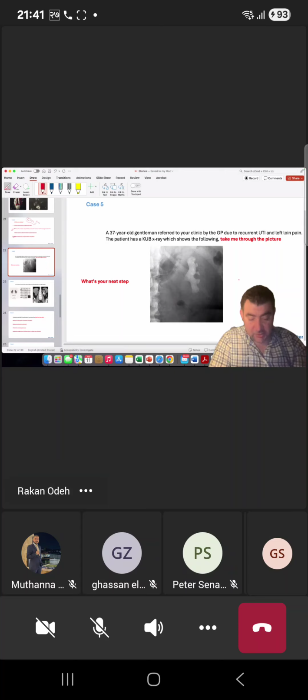Okay, go ahead. So you have a 37-year-old gentleman, referred to your clinic by the GP due to recurrent UTI and left loin pain. The patient has a KUB. Take me through it.